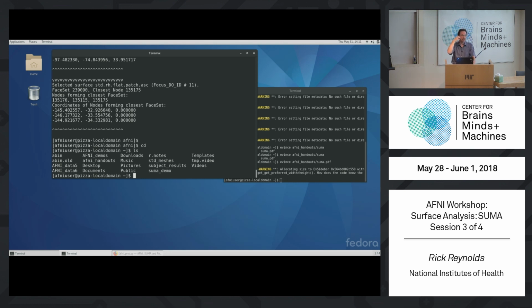You can't necessarily see the inner. If we just use this gray matter, this cortical ribbon for our analysis, we're not looking deep, but if you're interested in the cortex, maybe they're good. So what advantages do you get from a surface-based analysis? Well, it's the topology. First of all, if you map all your time series registered data onto the surface, for each node, you've got a time series, just like you have a time series in the volume.